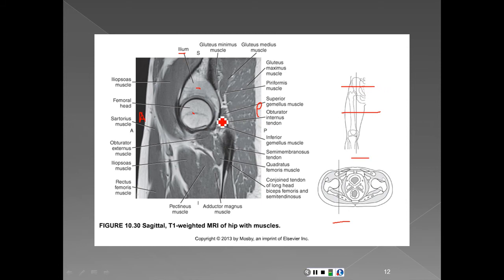Okay? So now we're oriented to where we are, and let's begin to talk about the anatomy. The iliopsoas muscle originates from the psoas muscles, goes into the iliacus muscle, and they both combine and form this iliopsoas muscle that attaches to the hip. So that's why the psoas muscle is important for runners and joggers. And when you see athletes, their psoas muscles are huge because it is a flexor of the hip, and this muscle acts to pull this hip forward so that they can get a good stride.